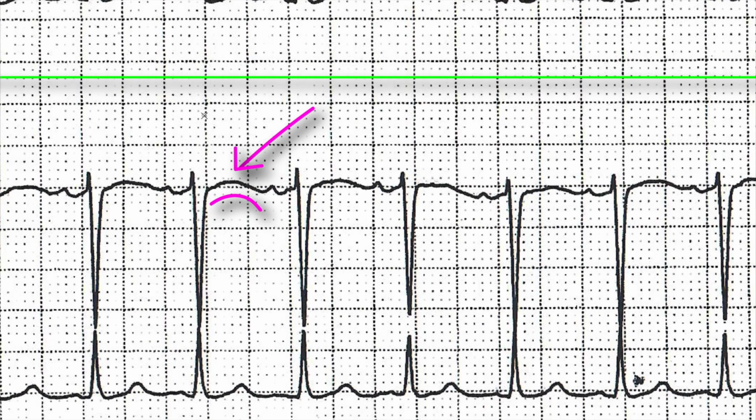So ions, in this case in particular, I want to take a look at other leads as well to confirm that we have an issue with potassium. Judging from the T wave I'm looking at down here, I would say that this is not going to be an issue, but I do have to double check it. And we'll see when we get to the 12 lead channel.